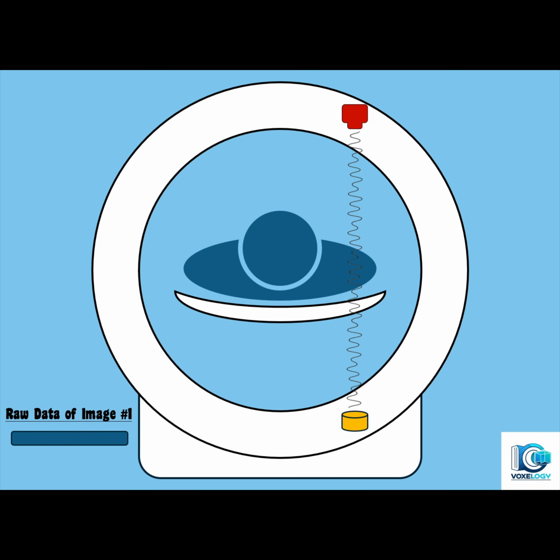The task of the X-ray source was to produce X-ray beams that passed through the patient's body. This beam had a small width and only passed through a small part of the width of the patient's body. In front of the source, the detector absorbed the rays that passed through the patient's body, thus recording information about a part of the patient's body.